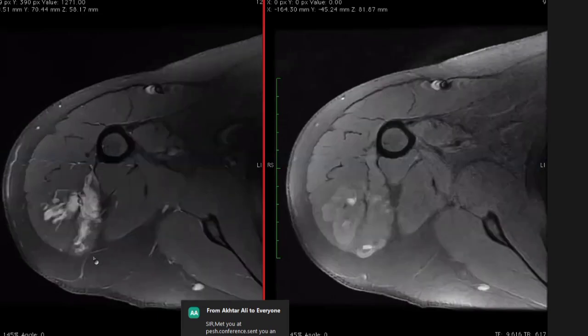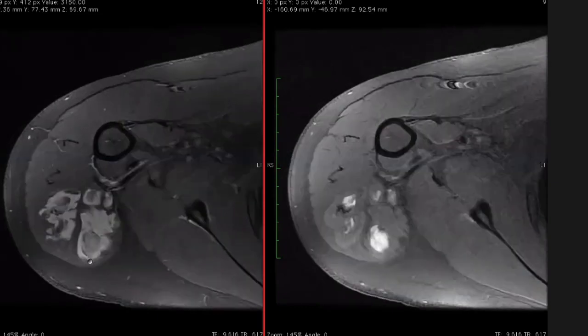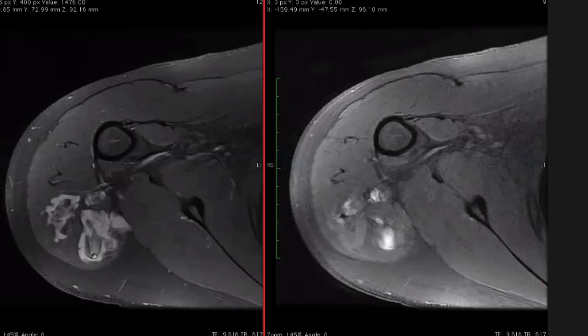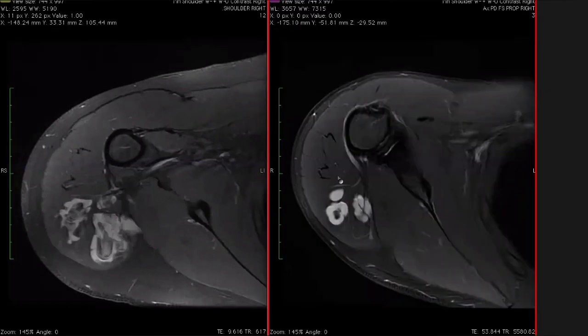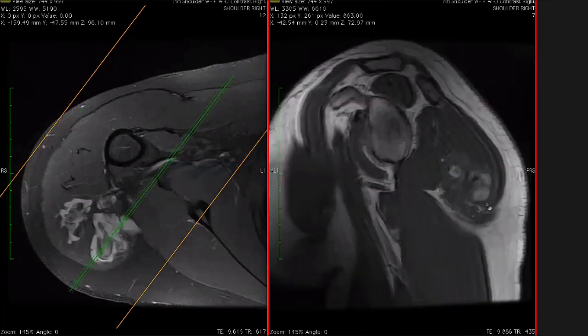Because in the venous malformation, there'll be just a cystic kind of thing, and there will probably be some venous flow in it, all right? So to differentiate between a high flow and a low flow, or a lymphatic malformation, we use ultrasound. When you do ultrasound, which I don't have for this case, this lesion will have spaces with just venous flow, or sometimes no flow at all. In a vascular malformation, the blood stagnates and it clots. So these are all clots basically, like we see in endometrioma or any hemorrhagic cyst, altered methemoglobin or old blood basically.